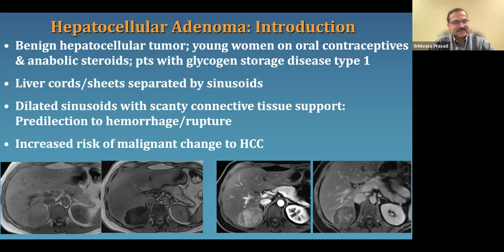It has characteristic findings in that one can have both microscopic as well as macroscopic fat for the entirety of the tumor, as opposed to the angiomyolipoma, where it has small to variable degrees of fat changes.